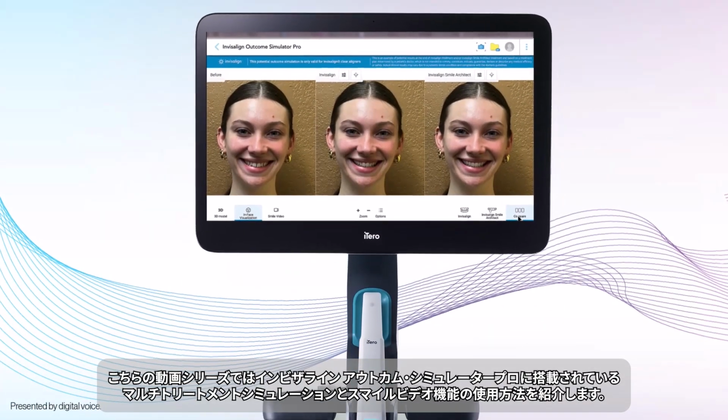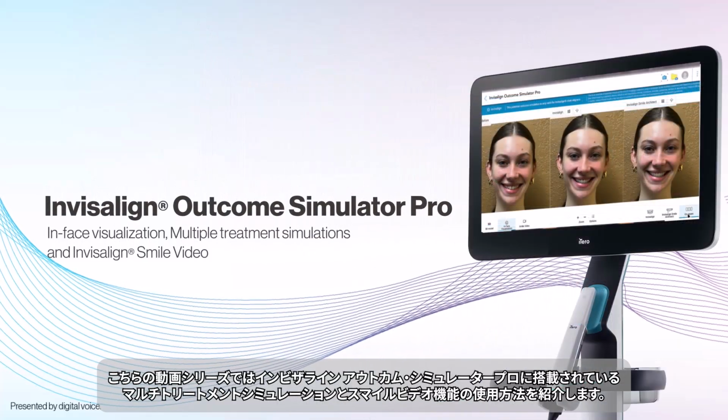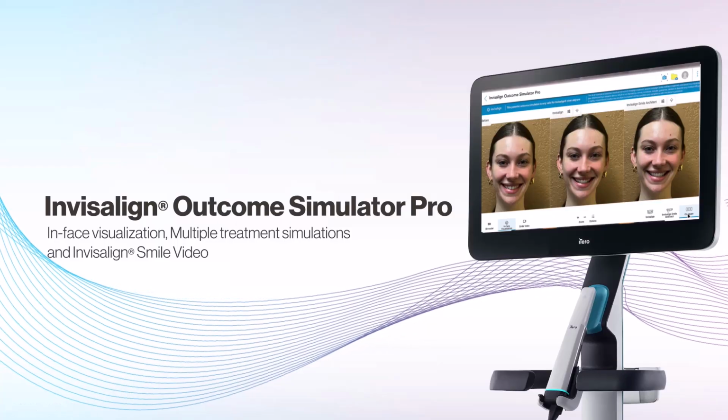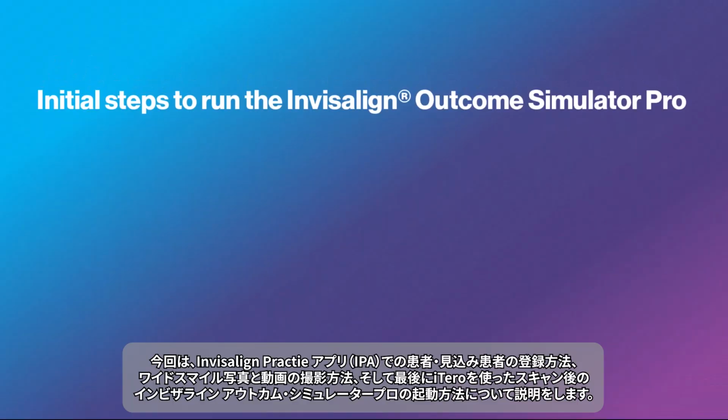Welcome to our video series on how to use Invisalign Outcome Simulator Pro with in-face visualization, multiple treatment simulations, and smile video. In this first video, you'll learn the initial steps needed to run the Invisalign Outcome Simulator Pro.